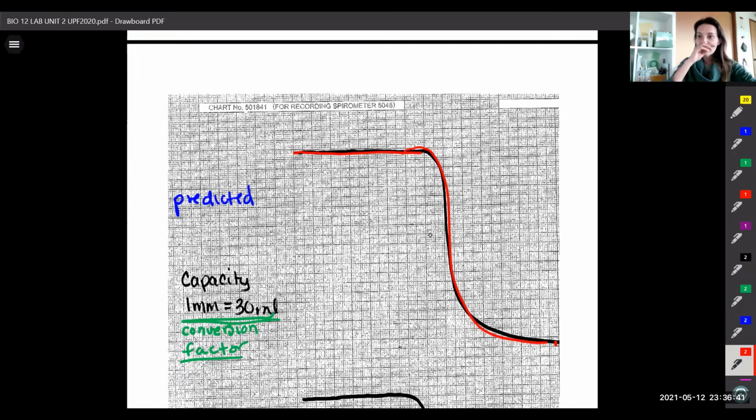And so what we don't want to see, and sometimes it takes individuals several attempts to get it right for themselves, because it is kind of a natural thing to think about, once again, breathing as forcibly as you can into one of these machines while plugging your nose. But we wouldn't be going slowly, that's not as quickly as you can do it, right? You want to go as quickly as possible. Otherwise, that's when we're going to see collapse of the smallest bronchioles if you have an obstructive disorder and you're trapping air.